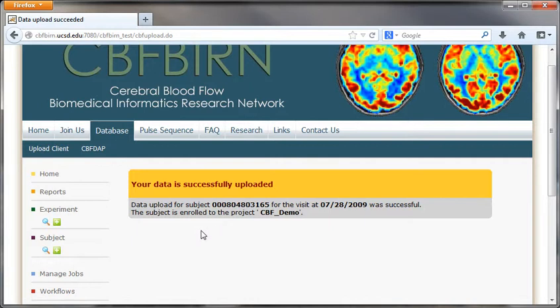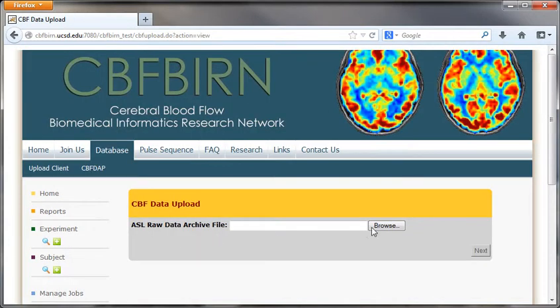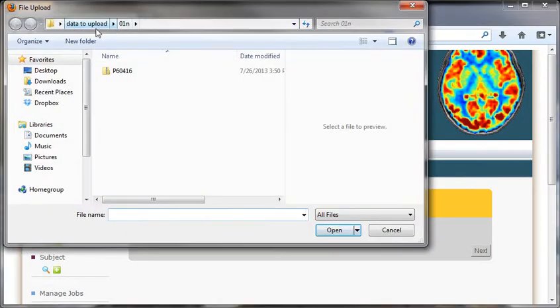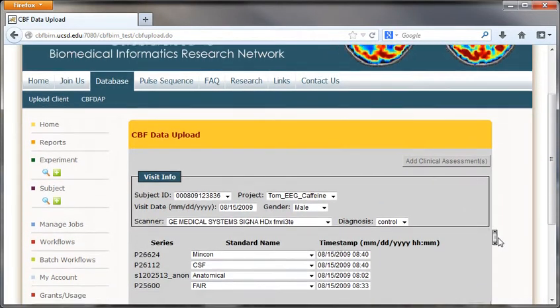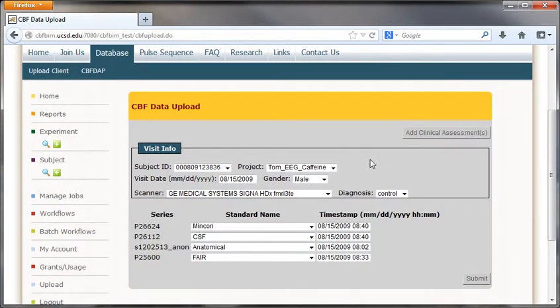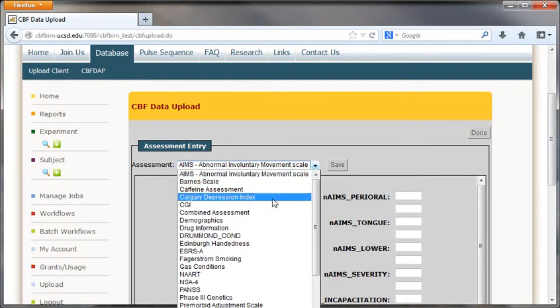Let's now proceed to the second upload. As we said, we will assign different assessments to this upload. Go to Upload and choose the second set of raw data. We will again use John Smith under Project CBF Demo. Click on Clinical Assessments, select Caffeine Assessment.